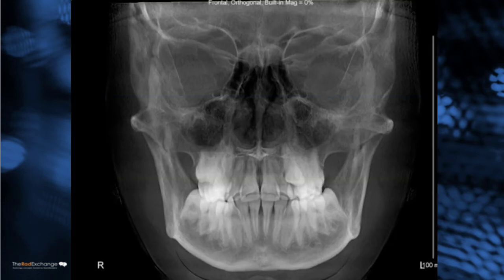Also included in this would be a frontal projection, and often it's much better for evaluating asymmetry. I've asked an orthodontist why they like the frontal, and they said to me that many asymmetries were maybe undiagnosed with conventional imaging, leaving the orthodontist at a loss as to why the case didn't work out. So sometimes asymmetries are difficult to see in conventional 2D, and here we have a great projection. We also eliminate the vertebrae in this projection, so we just get the teeth and jaws.